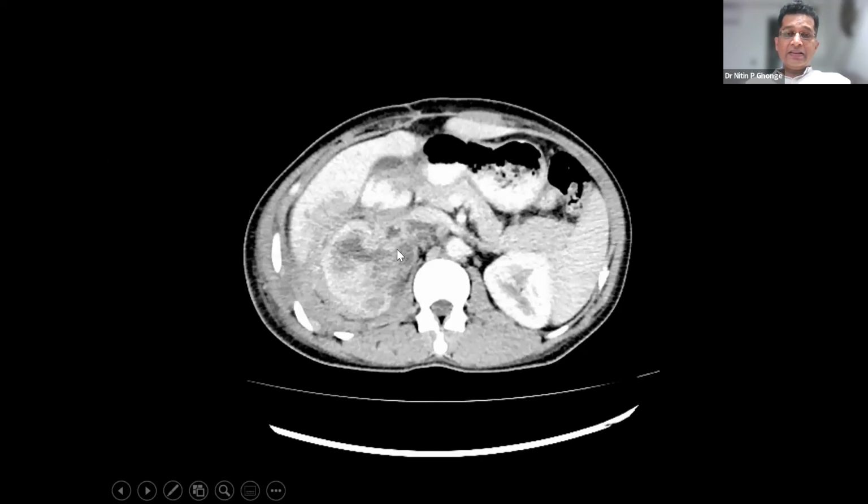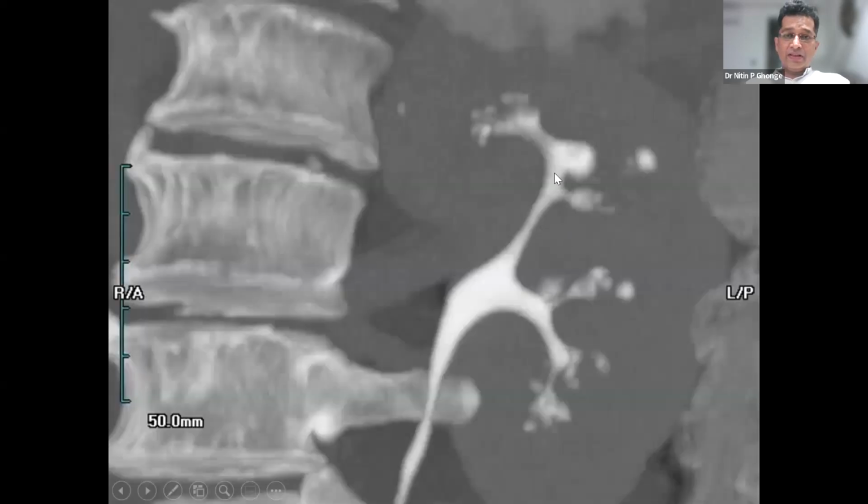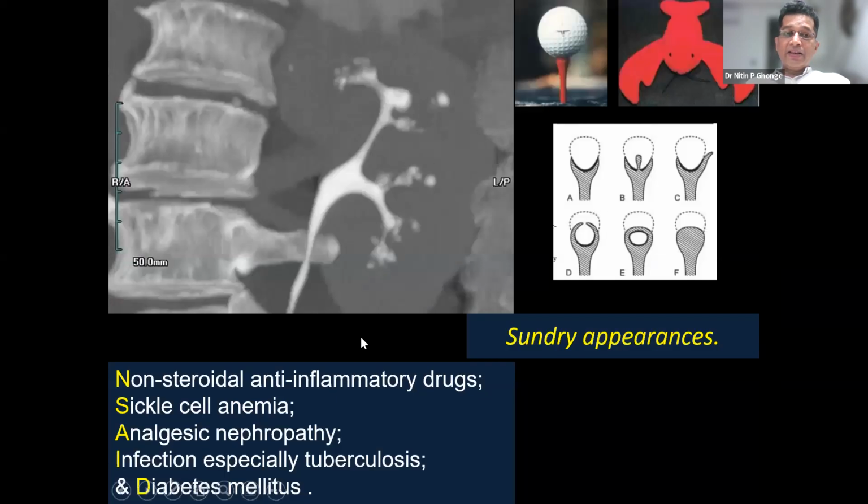Here again, another example, we can see the pyelonephritis, areas of abscess in the right kidney with formation of right renal vein thrombosis. Another CT urography image, we can see the loss of normal calyceal cup. The calyceal cups are completely lost. Weird abnormal shapes are seen along the calyces because of the renal papillary necrosis, which can have varying shapes as shown in this image.